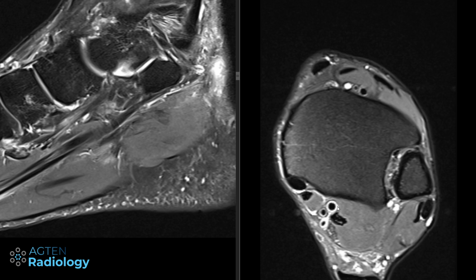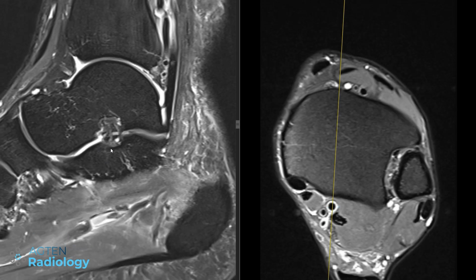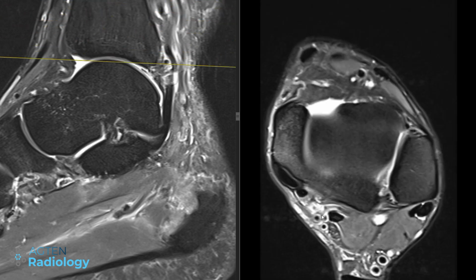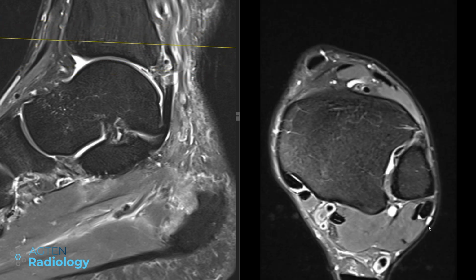And the veins around the ankle sometimes have quite substantial flow voids, which can easily be mistaken for thrombosis. But here in this case, this one here, because it looks a bit funny, could be, but maybe it's too much for flow void. And you can check the other veins, they don't show the same things.